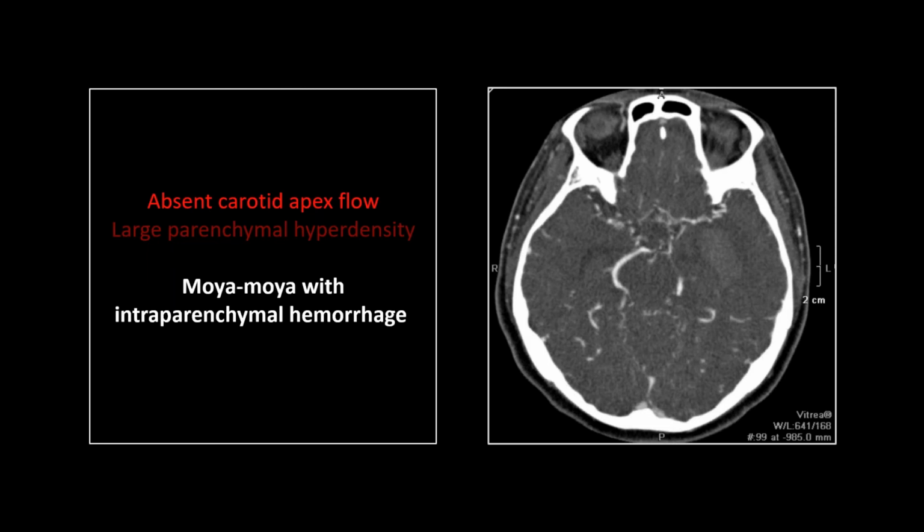This can arise due to a number of abnormalities, usually involving the skull base and usually causing occlusion of the carotids for that reason. And that's what we have here. You can see these tiny, wispy little vessels all coming together and ultimately reconstituting the standard five-pointed star of cerebral vasculature. But in order to get there, it's got to come up through a puff of smoke of all these tiny dilated collateral vessels.